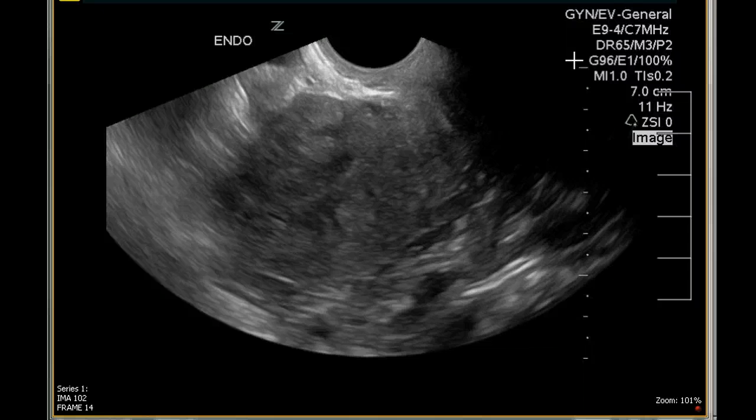Now, unilocular anechoic cysts are almost invariably benign, and the postmenopausal ovary does occasionally still produce some follicles, usually earlier on in menopause. This patient was 60, so we don't really know when she became postmenopausal.